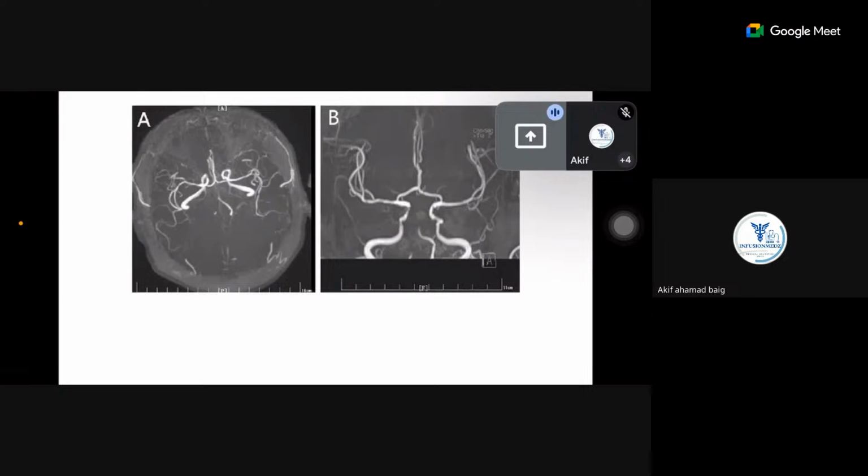Okay, what do you see? What is the blood supply applied by? Yeah, it is supplied by the ICA and the vertebral arteries. Do you see the ICA? You see that curvy structure which is present there? That is the ICA, and it is giving away its branches. What are the branches of ICA? The main branches are the MCA and the ACA.